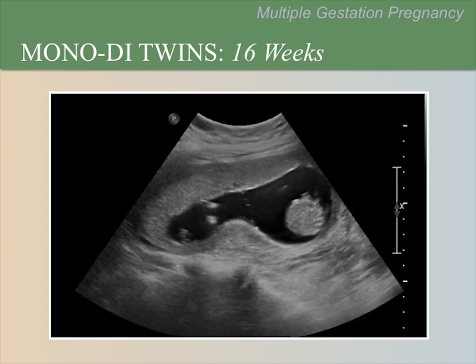Later in pregnancy, the membrane is more difficult to see. Do you see the membrane in this image? Here we have labeled the membrane to make it more obvious.